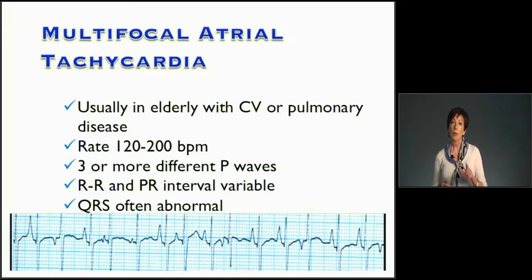And so for that one beat, there is a temporary bundle branch block, and that's just due to refractoriness of all of these Ps bombarding the AV node in bundles. So it's not uncommon to see some degree of aberrancy in your QRS complexes with multifocal atrial tach. Now in this case, on the slide, we don't see that. All the QRSs are shaped the same.